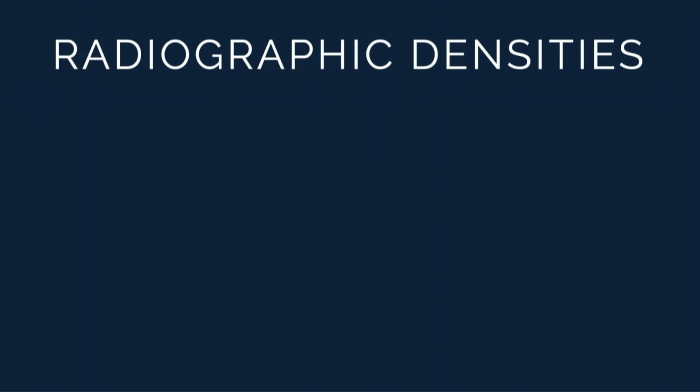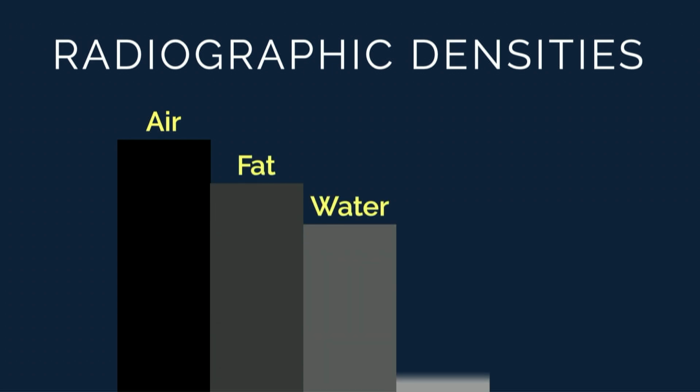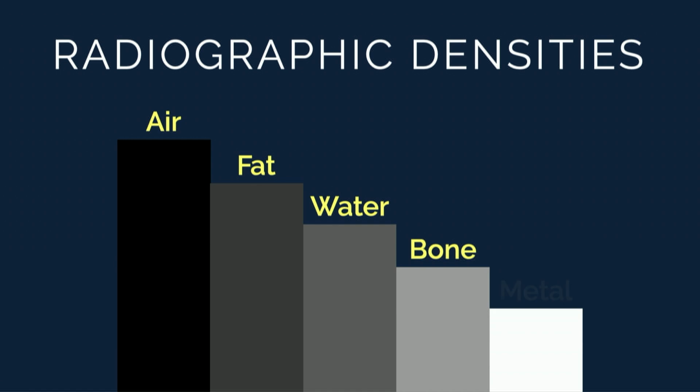Now, as I mentioned, these line stripes and interfaces, it gets down to densities. And so generally in radiographs, we talk about 5 densities, although there's really a million shades of gray, which, as I joke, is probably a really bad book. But you've got air, fat, water, bone, and metal. As I work with our residents or students, I always tell them, all right, I need you to tell me which of the 5 this structure is, and trying to help them stick it.